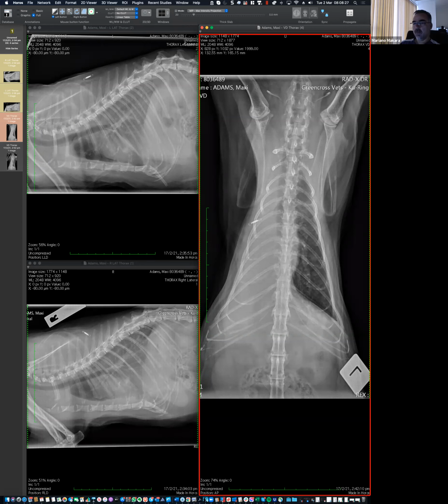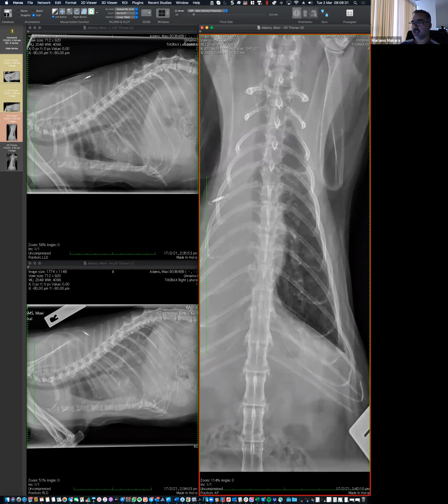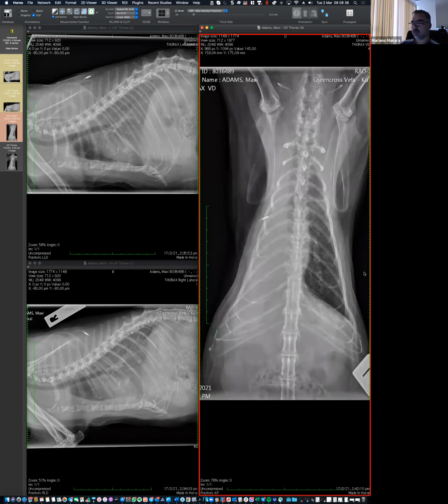Okay. Do you want to show us what, in particular, I mean, the interstitial is a hard one to pinpoint, but you mentioned the word nodule. So do you want to show us where you think there may be a nodule? If you don't want to, that's okay. It may be just a feeling, you know. Okay, good. I completely agree with that.